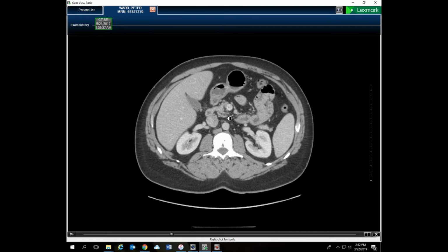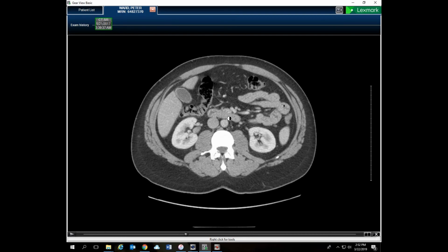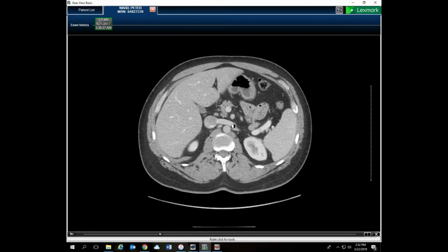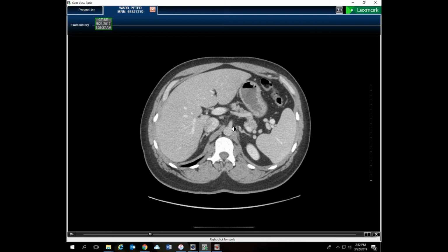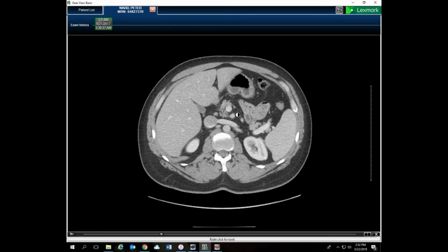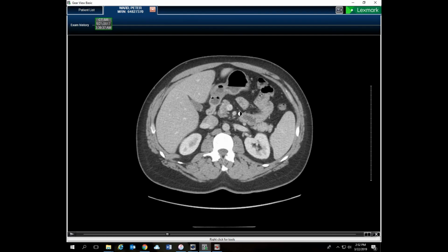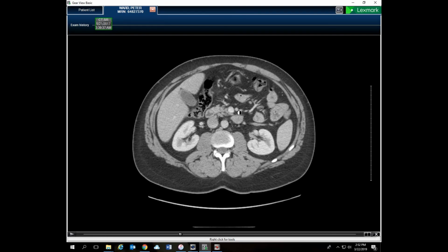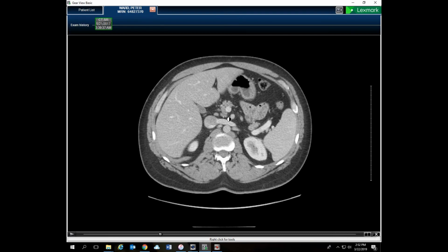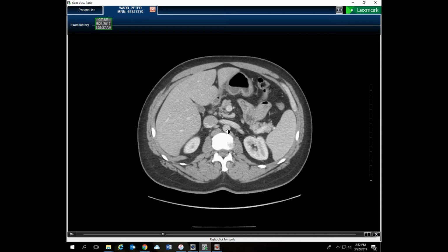And that happens right here. So here's that third portion of the duodenum. And here's the superior mesenteric artery. So follow the dot just to the left of my pointer. And good. So that relationship's important because you can sometimes have the duodenum get compressed if that artery pinches down on it too hard or gets traction from the gut. So that's superior mesenteric artery.